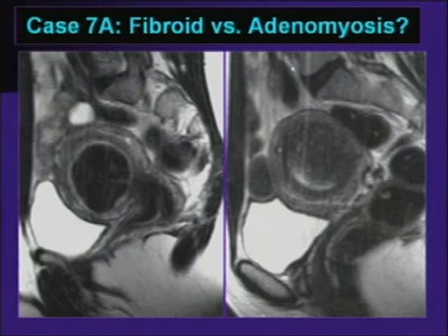Oftentimes, you can see adenomyosis and fibroids in the same setting. Here we have a large fibroid, and here is, again, that focal adenomyosis.